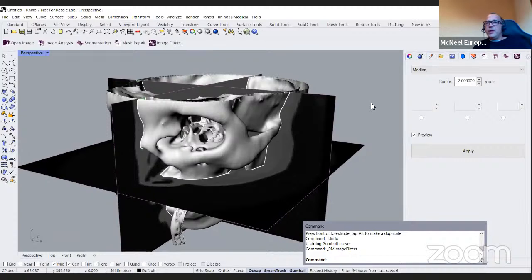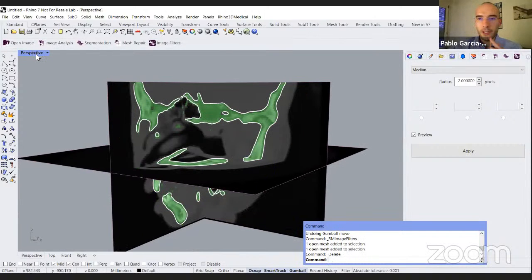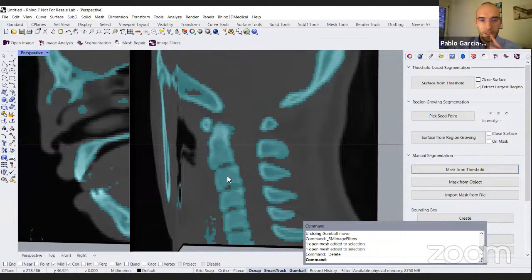Pablo, to extract bone in an articulation, for example, how to extract each vertebra or femur from the acetabulum? So how to extract each vertebra? Yes, so you should go with what I showed of the segmentation. You should go manually to extract.